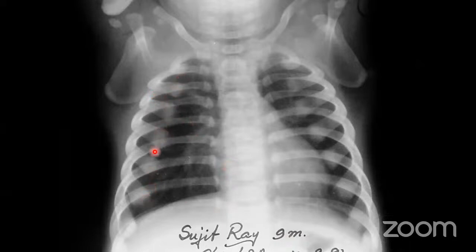It was a case of lead poisoning, or you can say heavy metal poisoning. So anterior ends become much more sclerosed and white. It was diagnosed by one of my professors, Jayanto Bose, who said the child might be suffering from lead poisoning. So get lead levels done, and it came positive.